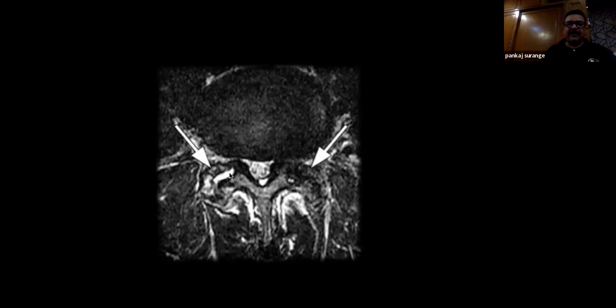Because it is an inflammatory component, there is no point in denervating the joint. We can simply go inside the joint, aspirate it, and put the steroid inside, and it will take care of that. There is no point in an intraarticular injection here. It's a totally degenerated joint. We have to denervate. We have to do the medial branch ablation over here. Same patient, same level. One side we'll do intraarticular, one side we'll do denervation.